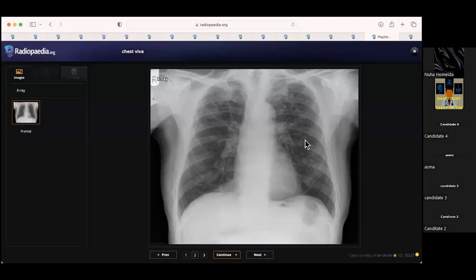So you're talking about these. Yes. Can you have another look at the apices? What do you think about the lung apices here? I can see a few nodules. No, I can't see. So you're talking about these. I can see nodules, but I think they are more frequently noted at the middle lung zone. I can see a few of them in the upper lung zone, but not as much as the mid lung zone. Maybe the high resolution CT could be more useful in detection and characterization of these nodules.